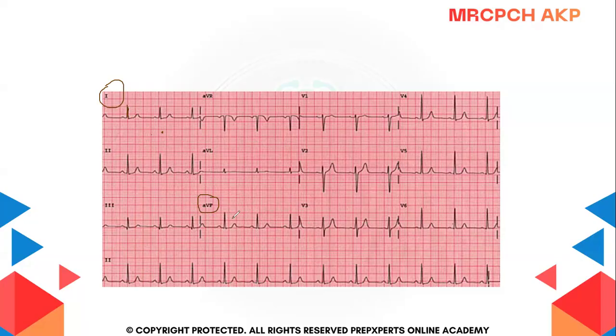Okay. And then you are having a look at the AVF. What is happening in the lead AVF? Is it going down the isoelectric line or it is positive on the isoelectric line? So you can see it is again positive. So which axis is this? Exactly, everybody's right. So it is a normal axis. Easy peasy mac and cheesy.